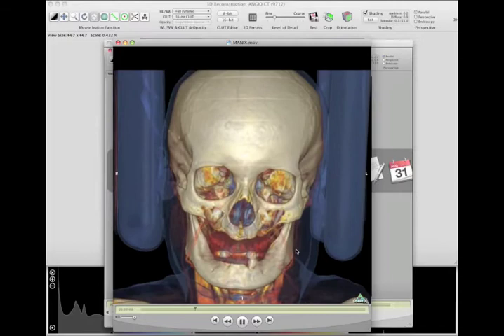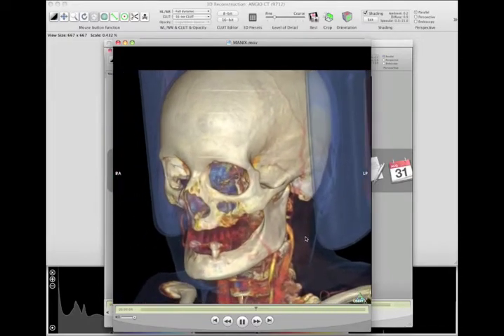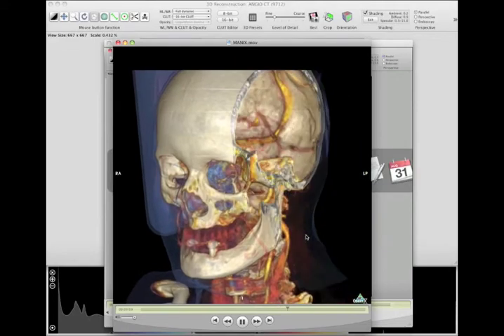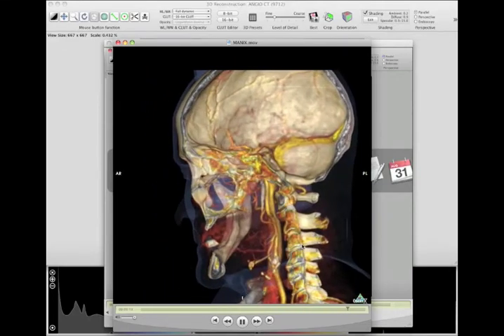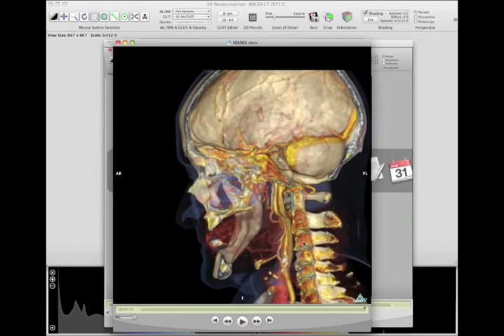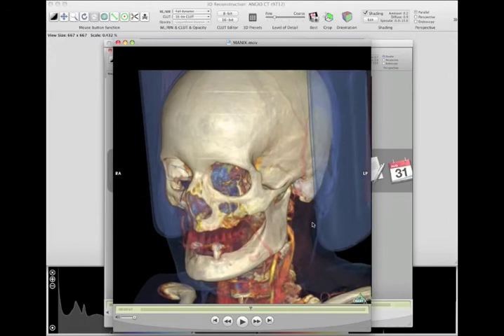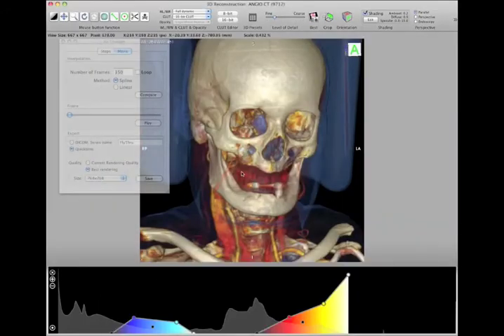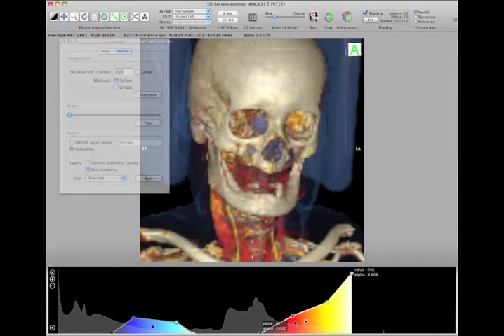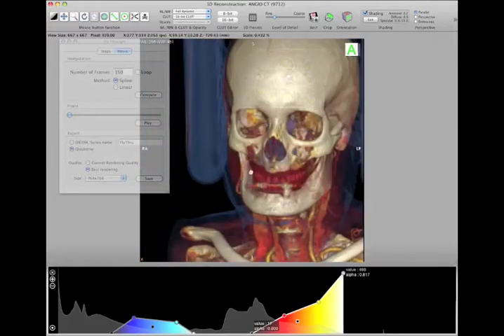And it should look like this. Right? Let's see if our animated color lookup table works. It didn't used to work. I was hoping that it would work in future editions. Let's see here. Okay, it didn't seem to take, so it may not work. So you don't have to worry about animating the color lookup tables. In other words, change the view and the cropping, but you don't need to adjust these. I don't think those settings are going to take. Maybe one day we'll have the ability to do that, but right now we don't.